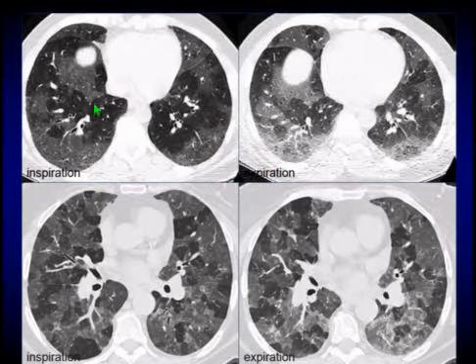And notice that these black areas become grayer, right? Because they're not holding on to air, or not air trapping. And so the hypoperfused lung, because the clot won't let blood perfuse that lung, becomes grayer and can expel air. And the more hyperperfused lung also becomes grayer. And so that difference between those two areas, or that gradient, does not become more accentuated, okay? Unlike the case we have below.